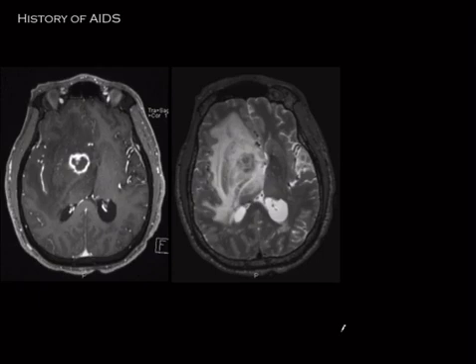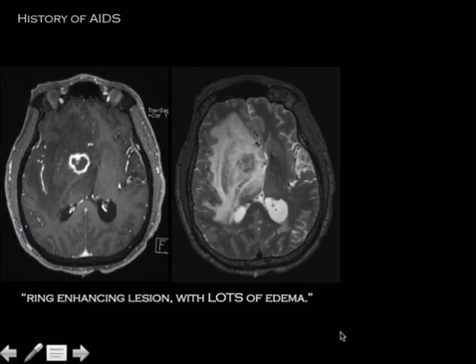You may say that it's out of proportion. It's a buzzword, okay? And now I'm going to show you the diffusion, and before I show it to you, I want you to mentally run through your head and say, how is that going to be helpful? So, what restricts diffusion? Hypercellular tumors. Lymphoma is the classic one for multiple choice, but GBM, medulloblastoma can also.